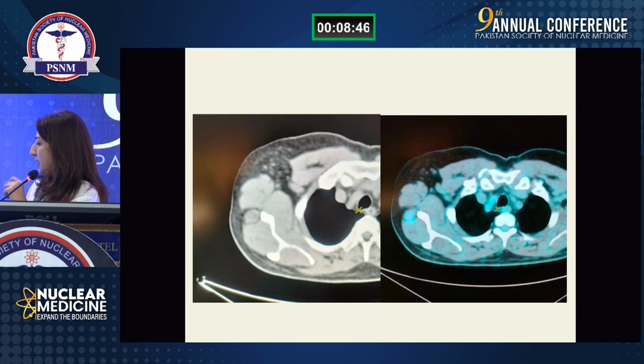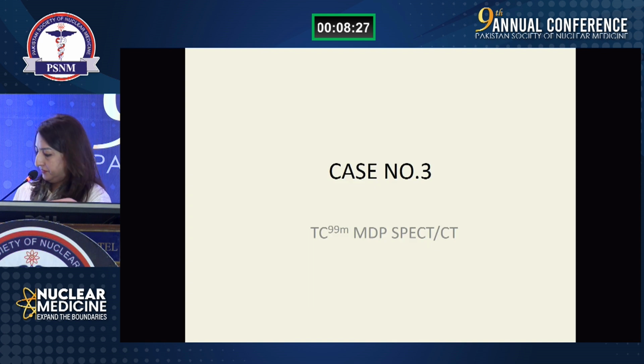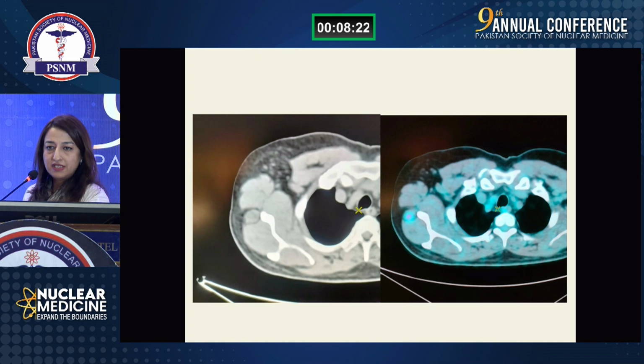They proceeded for FNA, and it came out to be inflammatory cells. So it was given Deauville X. Some authors say that Deauville X is a new tracer uptake on PET when it is not related to lymphoma. So it is not in standard Deauville scoring, but some of the authors say that Deauville X can be written for any new uptake that is not related to lymphoma, a benign uptake.